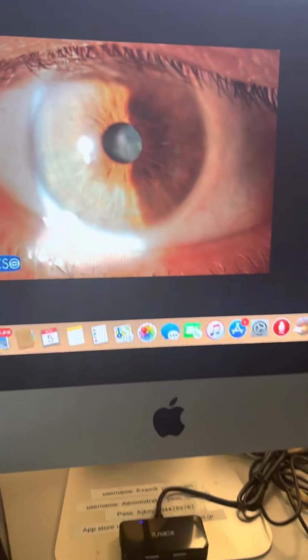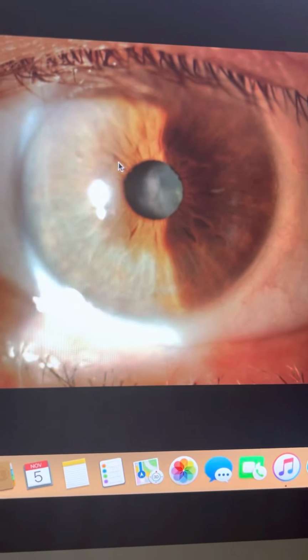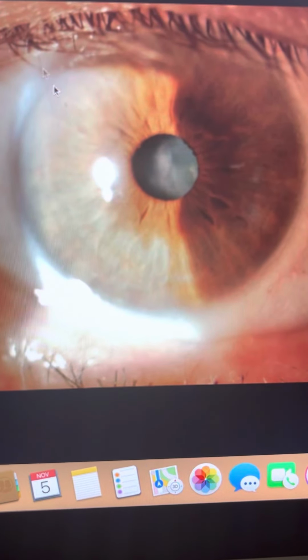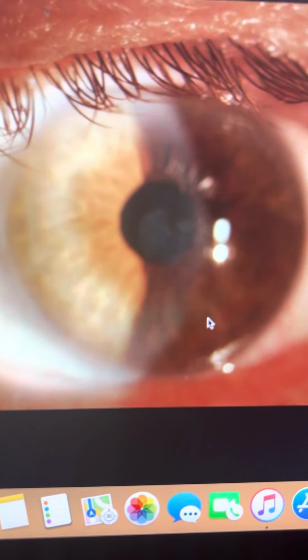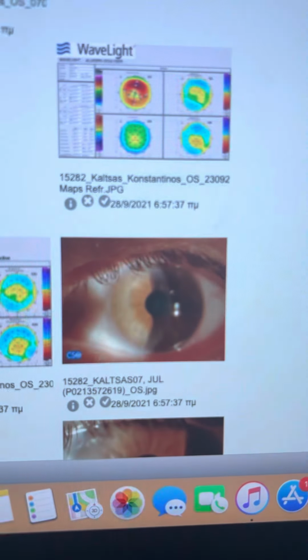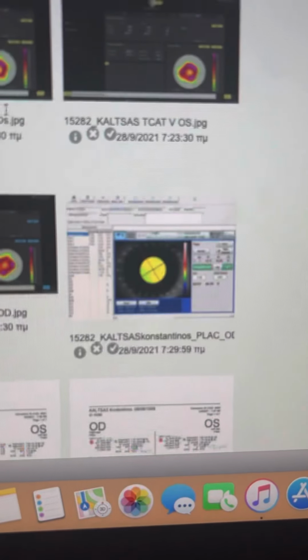I want to share with you some very important information in evaluating what you can see here, a cataract patient. The only particular thing with this gentleman, who is in his mid-60s, is that we had undergone together a hyperopic LASIK procedure 10 years ago, exactly 10 years ago, and that did well. We can see the hyperopic correction on the Pentacam maps and the topographies of this right eye.